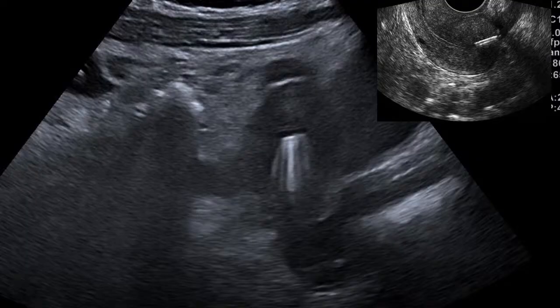In this presentation, let us discuss an intrauterine contraceptive device. When someone has an intrauterine contraceptive device and starts to have lower abdominal pain, the assumption is that the IUCD could be causing the pain. At times, the IUCD will be very much innocent.